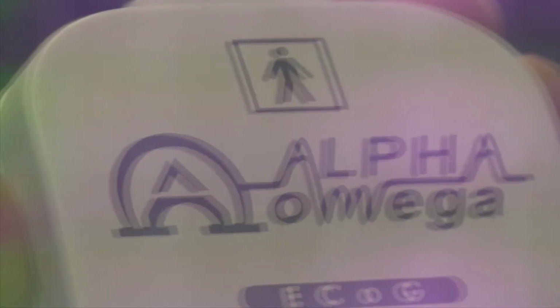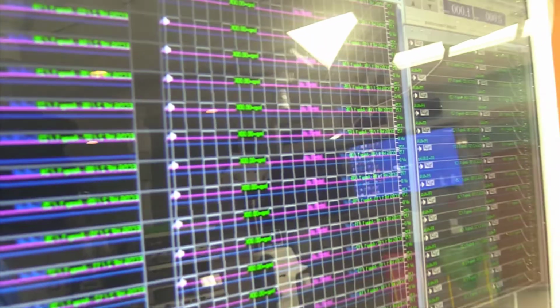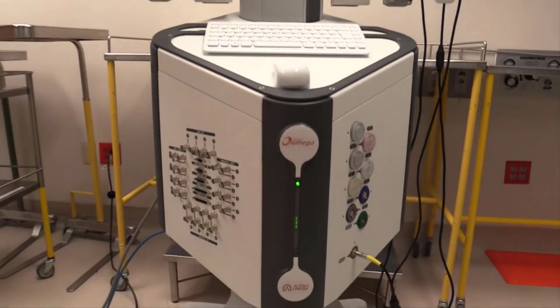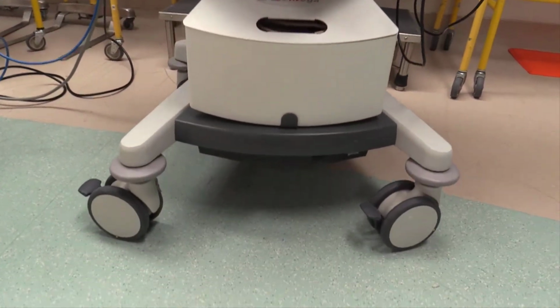The Neuro Omega system, produced by the company Alpha Omega, is designed for use during a deep brain stimulation procedure. The Neuro Omega contains 122 channels and has real-time subthalamic nucleus navigation. It can both record and stimulate the channels simultaneously, which can be controlled programmatically through BCI2000.